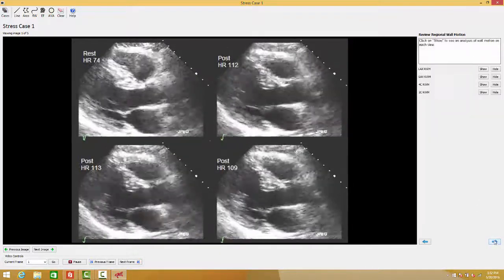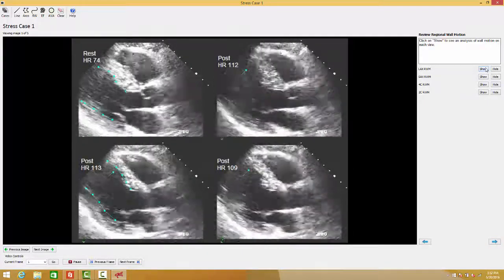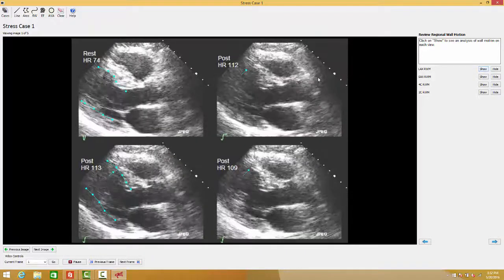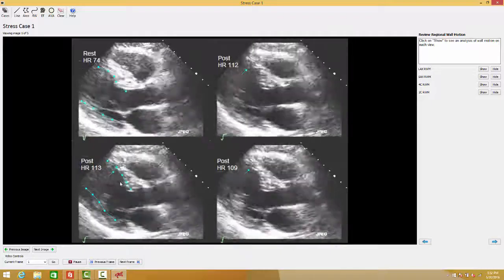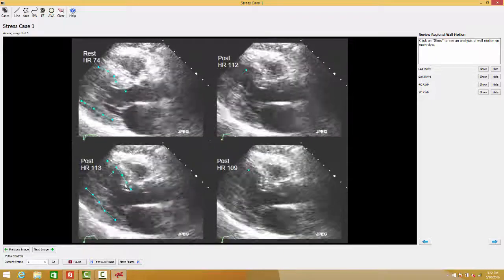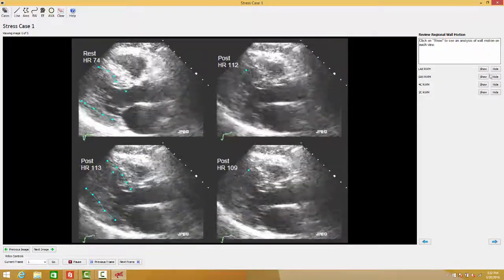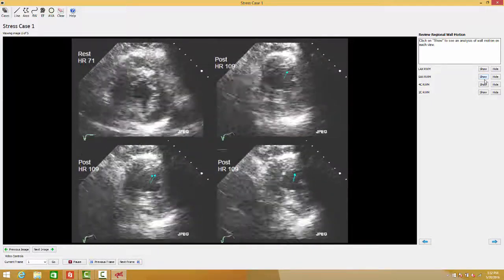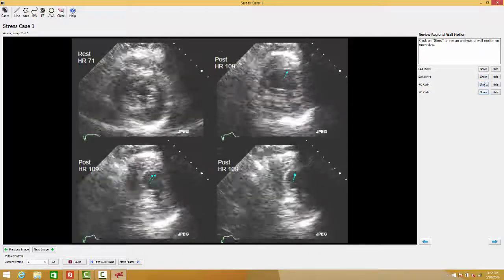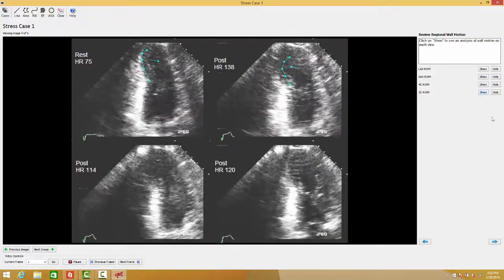And there's a little bit of instruction there. It will help to identify how we made the diagnosis. You look at it, and you can see the arrow points out the non-moving wall. They also use the regional wall tool, as I did, and showing the wall motion. That's in the long axis. There we point out the abnormal wall in the short axis. We show the same in the 4-chamber view and in the 2-chamber view.